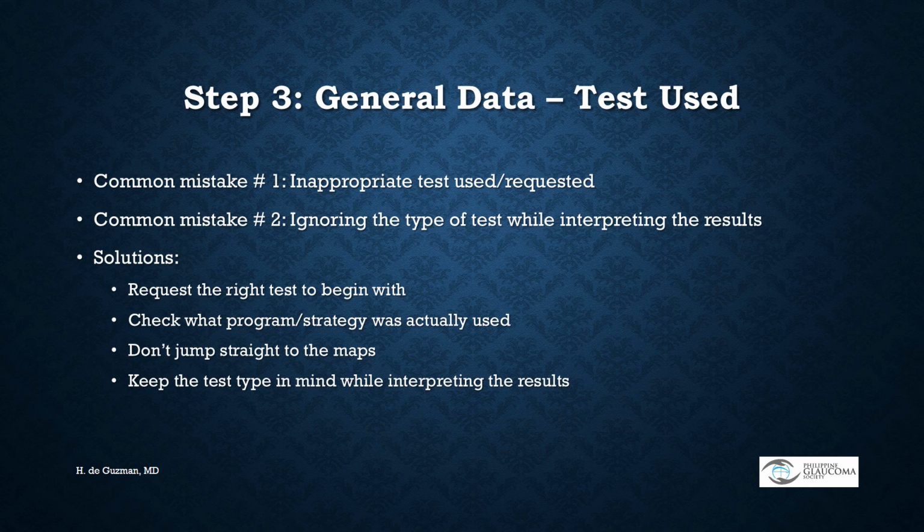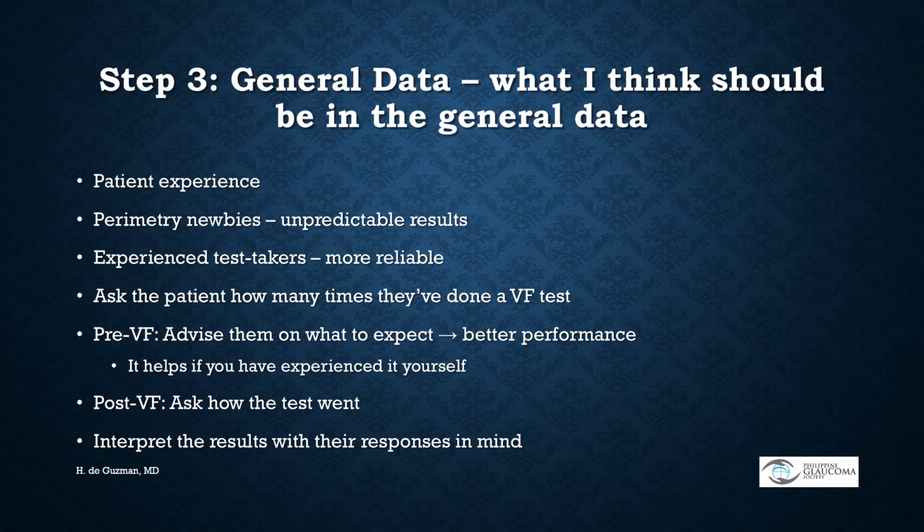while interpreting the results. What I wish was included in the general data is the patient experience. I wish there was a spot there which indicates how many perimetry tests the patient has done already, because people who are new to perimetry can have very unpredictable results. So what you do is just ask the patient how many times they've done a visual field.